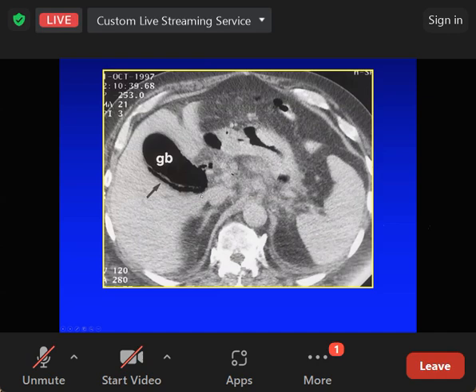Also upper abdomen, and this structure is the gallbladder. Why is it the gallbladder? Well, it looks like the gallbladder, it's gallbladder shaped, but it should contain fluid, shouldn't it? Well, we haven't got much fluid containing stuff here, but here's a little bit of bowel with fluid, I think. It should be that attenuation. It's not, it's black. That's air.